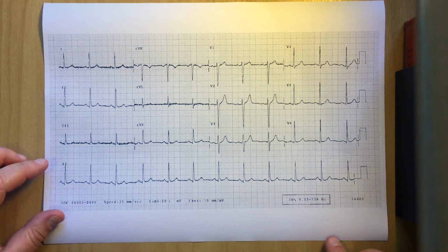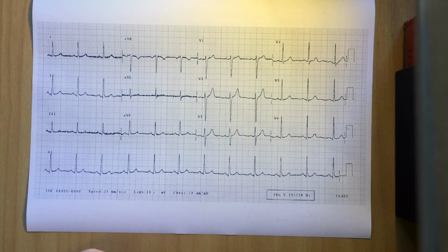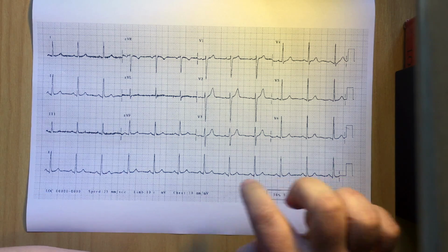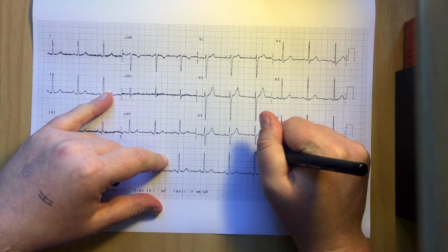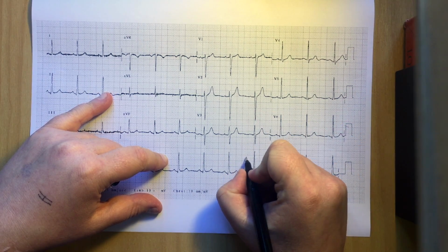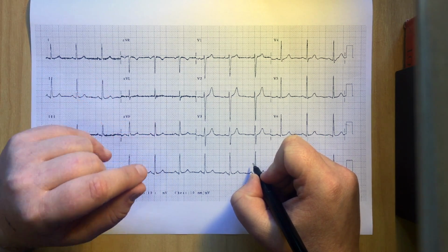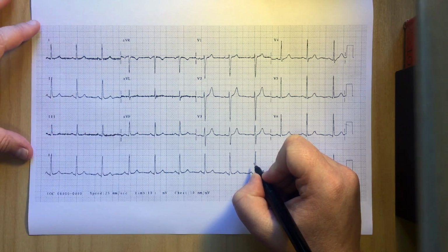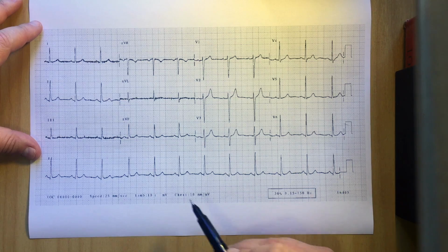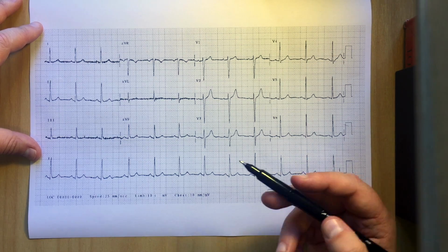All right, so going through each of those options with the sample ECG. First of all, we can use 300 divided by the number of large squares. So for example, between this R wave and this R wave, we've got 1, 2, 3, 4 large squares. So 300 divided by 4 is going to give us a heart rate of about 75. And our other option, this is pretty regular. That's probably about right, but let's just do the other option just for practice.